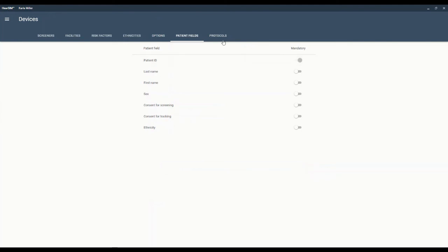The Protocols tab is empty by default. Your easyScreen comes with pre-programmed protocols you can use for screening. They were defined to be efficient and with high sensitivity. We suggest that you stick with the default protocols. For program supervisors who want more information about alternate protocols, the function of this tab will be covered in a separate video.